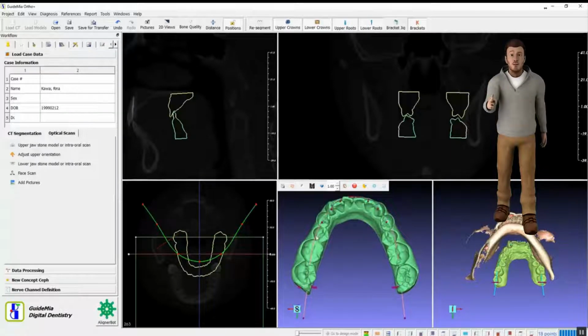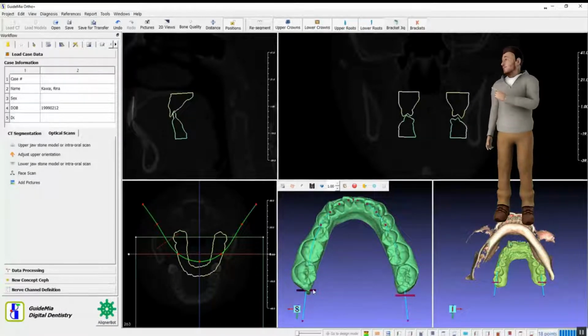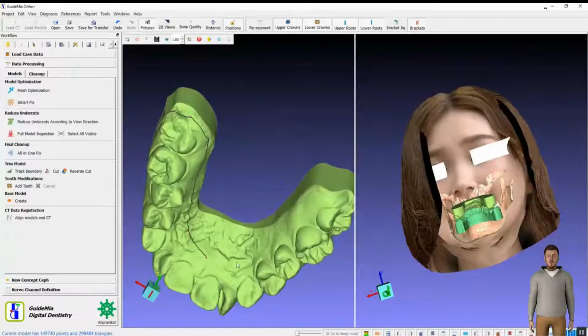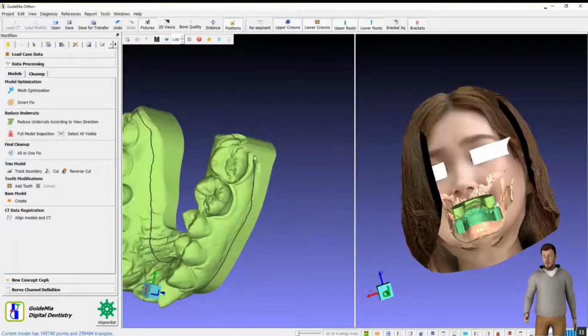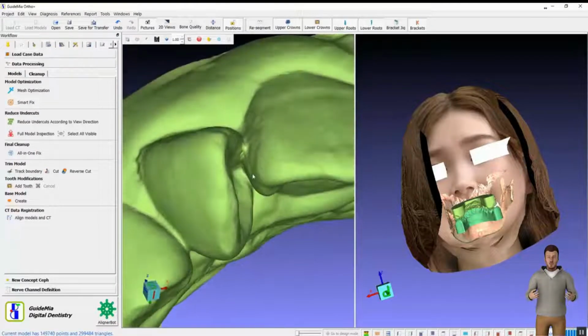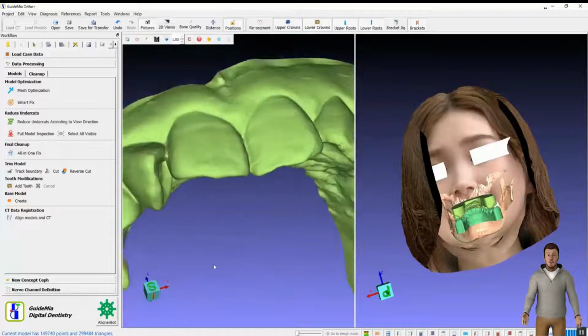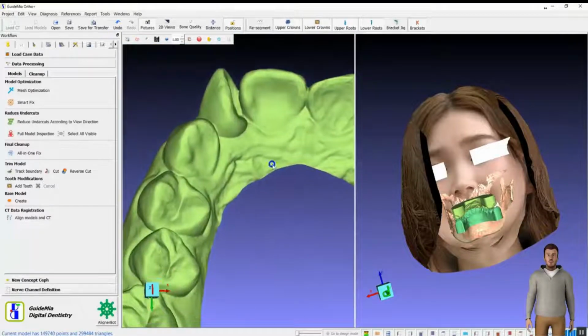First we draw a boundary curve of the tooth area, keeping some margin from the teeth. Then use the trim button to finish. The operation, all-in-one fix, is used to fix typical model problems, including small holes, triangle overlapping, self-intersection, sharp areas, topological issues, etc., in just one mouse click. When we want to switch models, we use right mouse click.